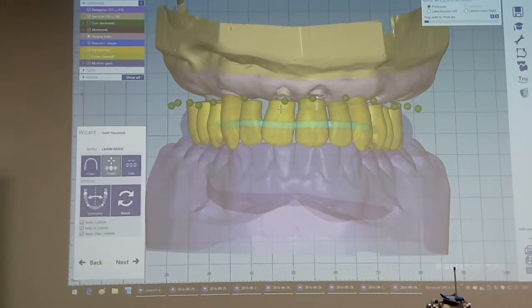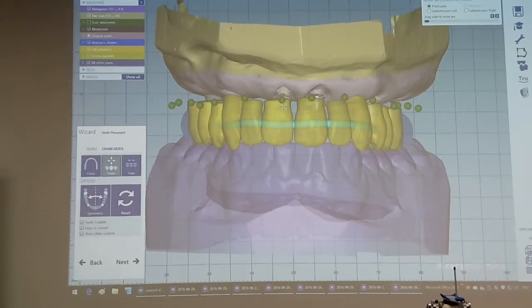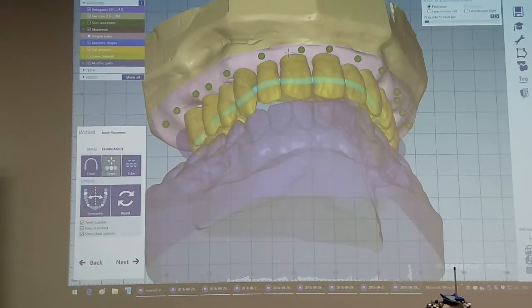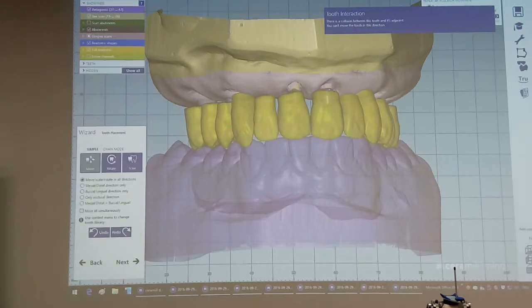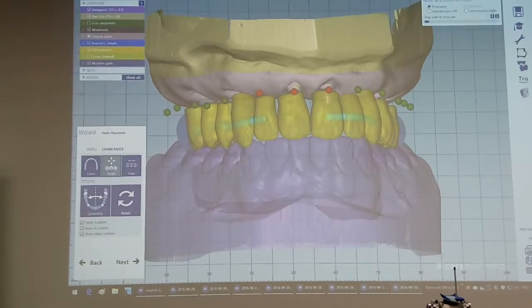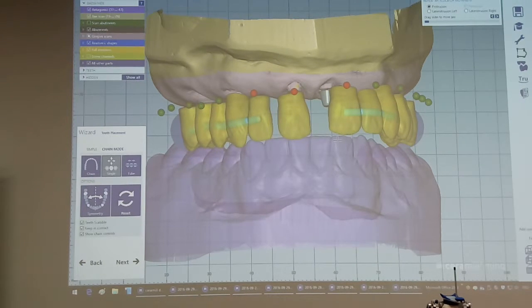I can rotate, but you see we always have some contact, the other teeth are also in contact, so we are completely sure that this movement is on one chain. I can unlock the chain. Wait, sorry. Then I can do separate movements like this.